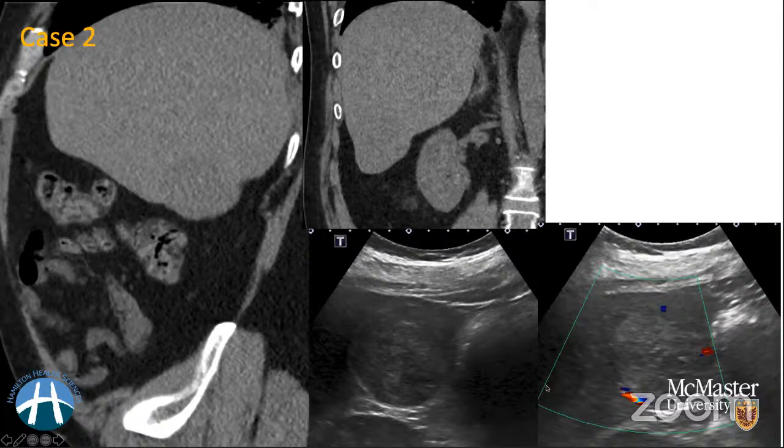So whenever you see such an appearance, if you pay close attention, this particular lesion is echogenic compared to the surrounding liver parenchyma. Whenever you see echogenic lesions, there are n number of things which can come to your mind. You should start with the benign spectrum and then move towards the malignant spectrum. In terms of benign, the usual differentials on ultrasound will be, as you said, FNH, adenoma, hemangiomas, focal fatty change, or other mesenchymal tumors like angiomyolipomas, which can have fatty components within them.